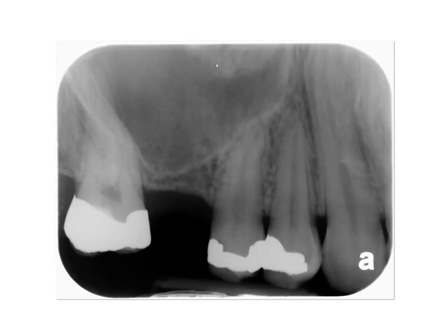Again, that opacity most likely represents either zygomatic process of maxilla or inferior portion of the zygoma. But to know for sure, you need to see what I showed you earlier, where there was a clear distinction of that kind of U or J-shaped opacity.